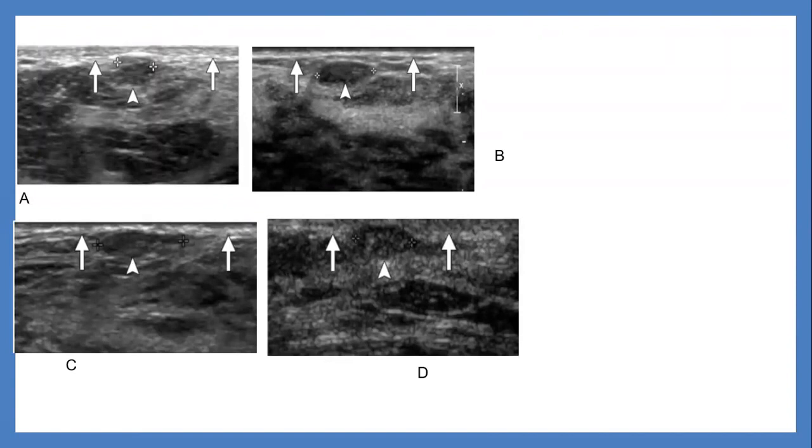If we look here, these are typically giving a little bit of an obtuse angle with the dermal layer, signifying that the lesions are most likely arising from the hypodermis rather than from the dermis. It doesn't show the claw sign, and the angle is more or less obtuse.